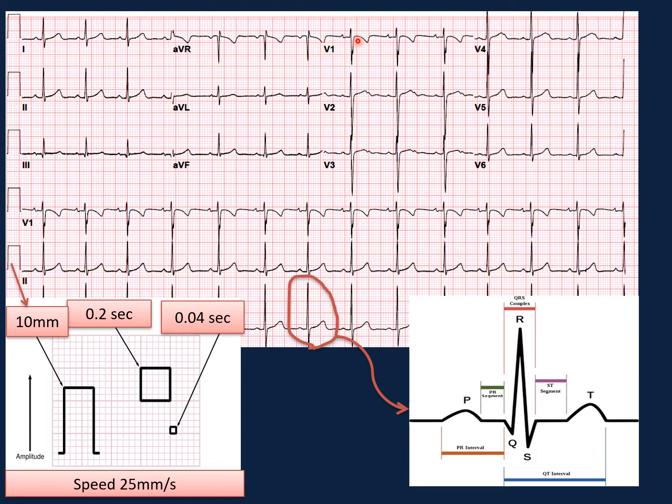But T wave can be positive normally in newborns less than 7 days, or less than 1 week of age. Afterward, if it stays positive, this is suggestive of right ventricular enlargement, just suggestive, but can be normal in older children, like older than 6 to 7 years of age.